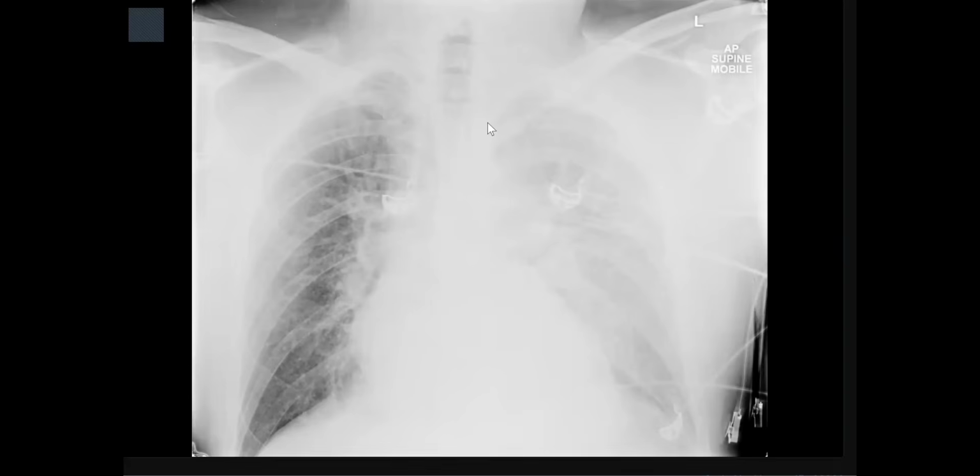But if you hear this history from the examiner, chest pain or cough or dyspnea after episode of vomiting, look for any pneumomediastinum and mention it, even as a pertinent negative. Tell the examiner, I know what I'm looking for. Okay, no definite pneumomediastinum. However, this case needs a CT scan to look for it.